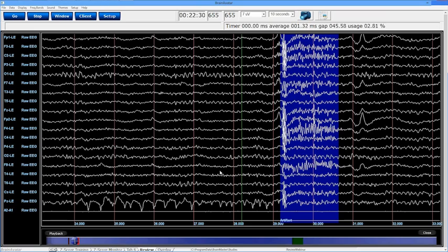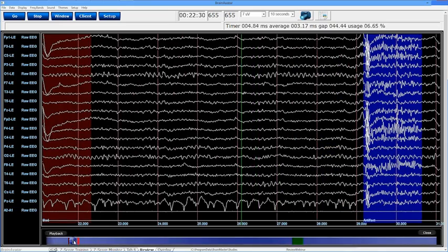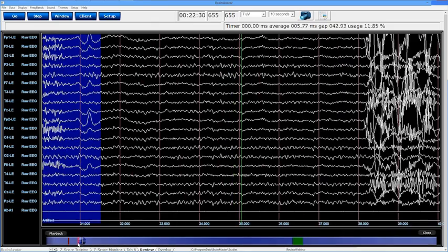And when I click off, once again, you're going to notice 3 more things. You're going to notice that this is a blue background right here. You're going to notice Artifact right here. And you're going to notice that this is actually a brighter red, and as I move, it's going to be in pink. All right.